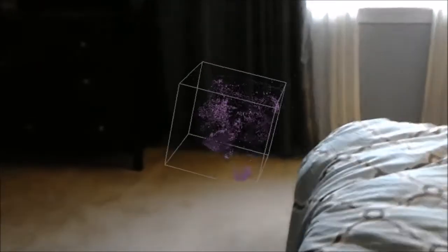The other problem is that we end up with this very large mesh. So it takes up a lot of space in memory. This is not really a huge problem on most workstations that you might use that have many gigabytes of memory, but the HoloLens is a little limited. It only has 2 gigabytes of memory. So even if we were willing to wait long enough to build a giant mesh for a very large study, the device would probably run out of space.